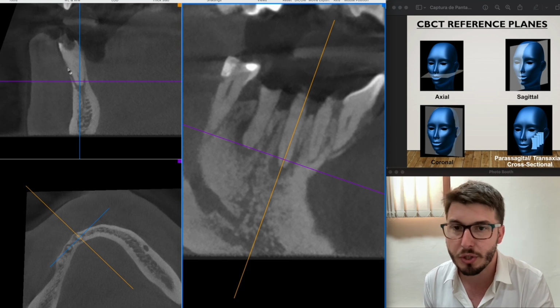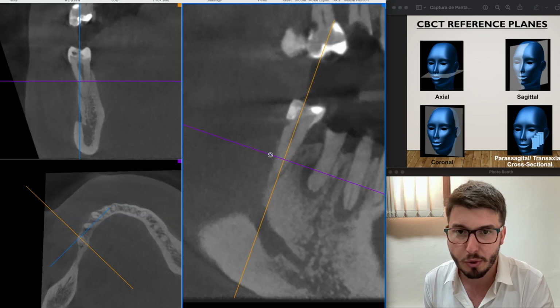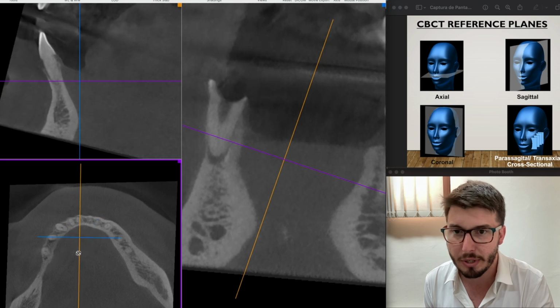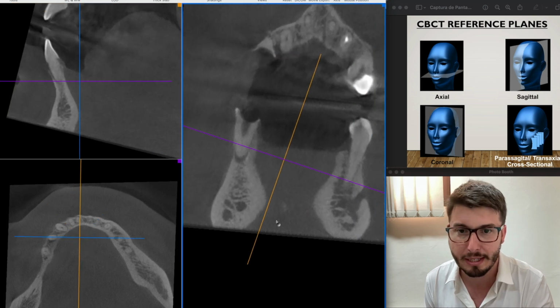With bone loss associated and everything, let's try to describe these lesions properly. We also can see this premolar with cervical lesions and everything. But all right, let's discuss the other alterations a little bit later, because we have a lot to discuss about this case.